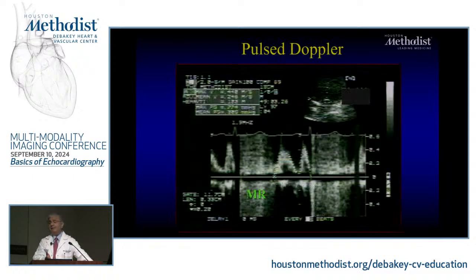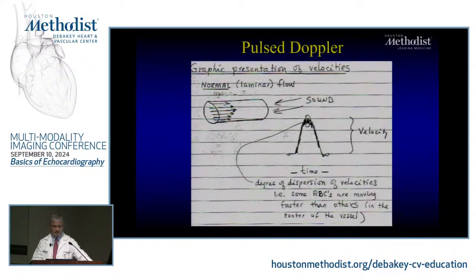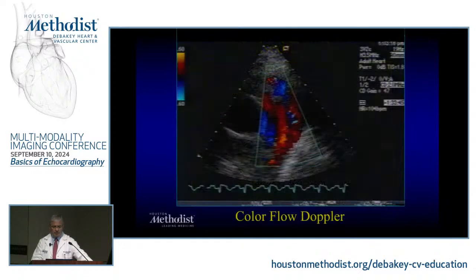And that's why in mitral regurgitation, for example, as opposed to the mitral inflow, you have what's called aliased, because I cannot tell which direction. So I have all this around me. Why? Because the mitral regurgitation jet is much faster. I have to have an incredibly high pulse repetition frequency for me to be able to solve it. Yes, you can with high PRF, but usually you use continuous wave Doppler for you to be able to solve it, right? So how about color Doppler?